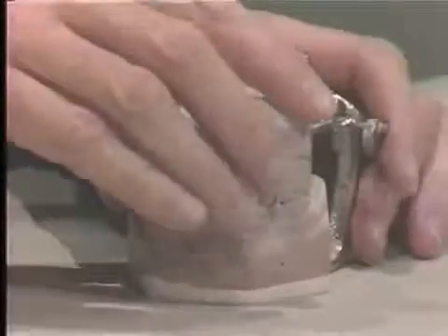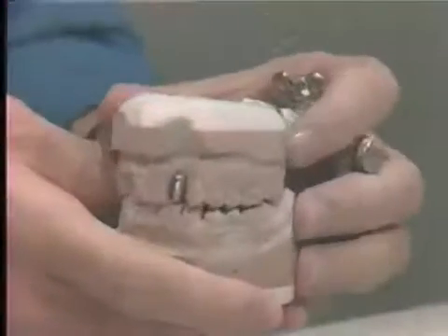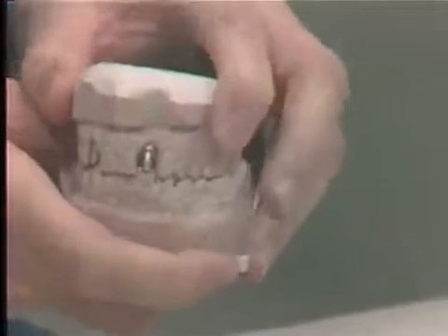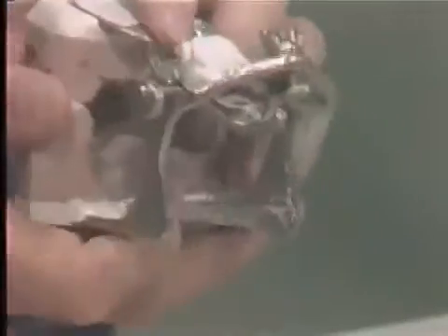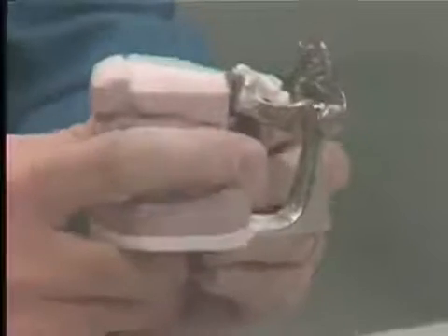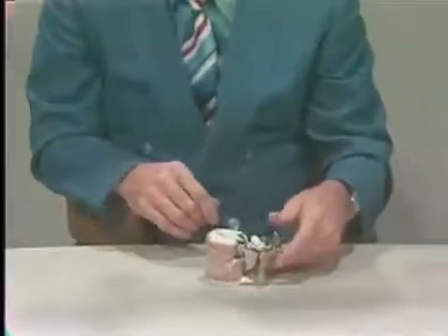It's exactly the same as the last one we showed you, except then of course you have guidance from both sides, and the guidance is predominantly from the teeth, as you can see if we move it slightly. And you have slight protrusive movement, and you do have some control over the closure. However, these rely on the teeth and on your knowledge of what you would like to gain at the end of whatever you're going to do with this articulator, rather than on the articulator being a direct guide.